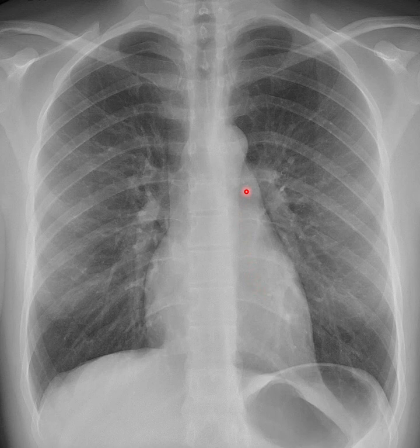Also, another thing that helps us to identify that we set the right technique is by looking for the little lung markings. The lung markings are the vessels and the lung tissues. So all of these little white squiggly lines we see, that's all part of the lung tissue and vessels that are in the lungs. We call those lung markings, and we make sure that we can see those lung markings. That's why we consider a chest x-ray a long scale contrast image, because we see all of these very tiny grays and all these little shades of gray in there.